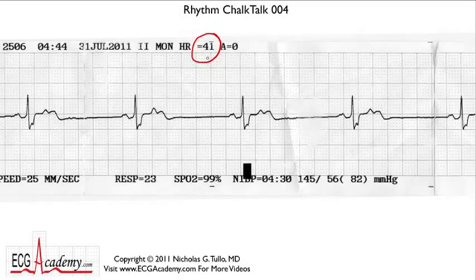Well, you look at the forest, and the QRS complexes certainly seem to be regular. And if you measure the rate starting at this heavy line and count off 300, 150, 100, 75, 60, 50, it is 40 beats per minute or so. That's pretty accurate. So let's see, are there any P waves?